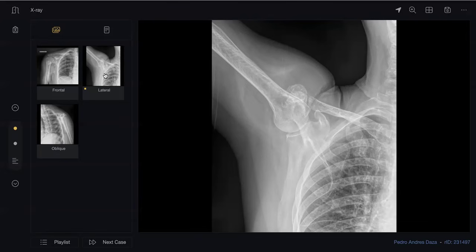No, this is a bony lesion, with a surrounding soft tissue component. It could be a cystic component because it's lucent rather than soft tissue density. Do you think this is a bony lesion with a cystic component? Any diagnosis coming to your mind? If we are thinking about a cystic lesion, this doesn't look like it. Let me think. Forget about the soft tissue lesion. Just focus on this bony lesion and tell me what this looks like.